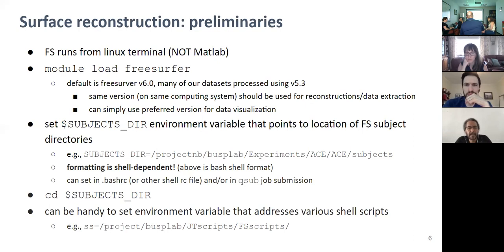Yes, you can tell. One, you can explicitly set the version that you're going to use, and then if you run it, there are files that are generated that tell you what version was used. Okay, that's fairly easy to find, and when we get to actually look, I'll log on to the server and show where that is.